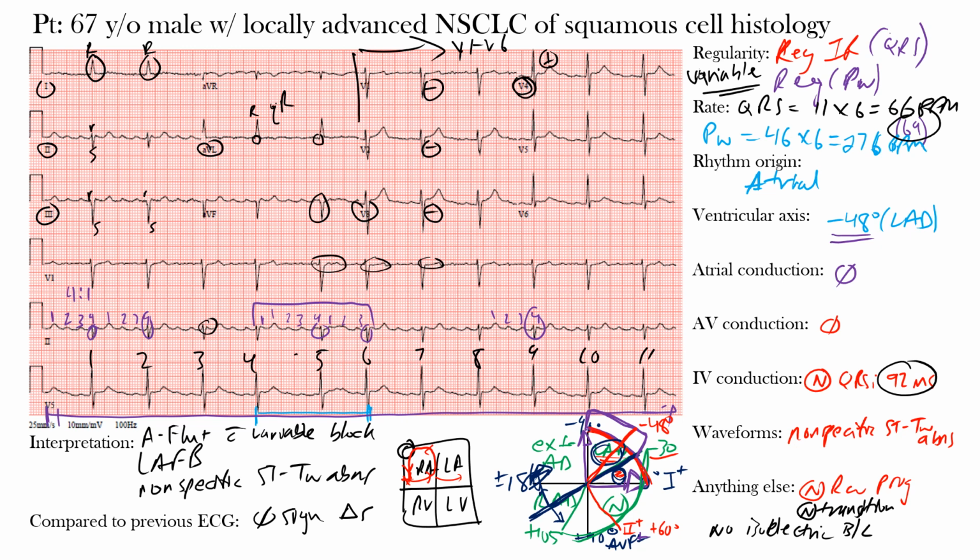And the circuit length is proportional to the right atrium size, okay? That should make sense, okay? The bigger the right atrium is, the bigger the circuit will be, okay? Now, there's no isoelectric baseline, as we saw above here. It can be classified based on the anatomical location and direction of reentry circuit as either the typical form, which is type 1 and more common, or it can be the atypical form, which is type 2, and that's less common. Now, in our course, we go into detail talking about these different types and how to differentiate them, so you can tune into that if you're interested. Okay, we won't mention too much with regards to the different types here.